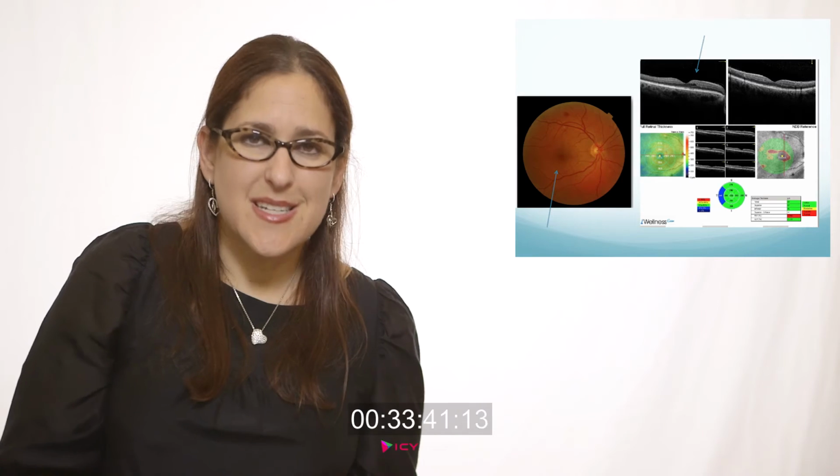We found a little pocket of edema in that inner retinal space that I surely could not see just on fundus exam, okay? This is gonna prompt me or help me move in the direction now of getting more testing to make sure that this patient doesn't have anything else going on that maybe we don't see fundoscopically.